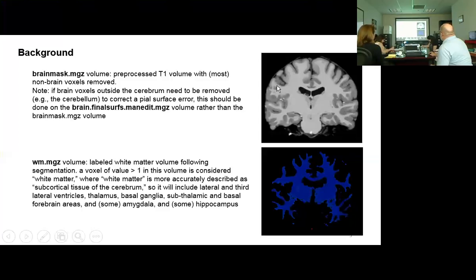But when you get into here, you see these little bands here? Those bands there are a sign of some movement. And this is actually a pretty good scan. But the distinction isn't quite as clear here. And here you would say that there's not a sharp transition from gray to white here.